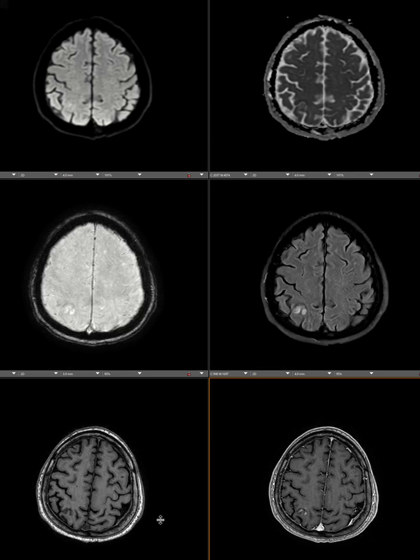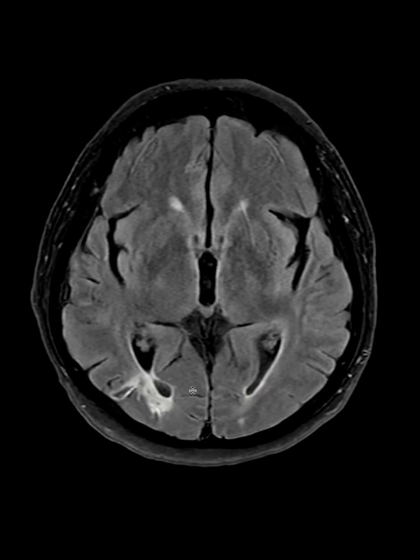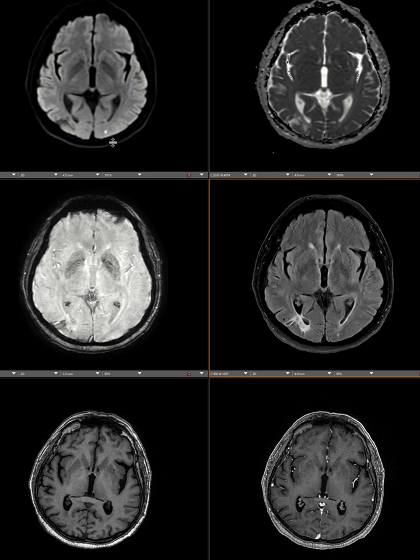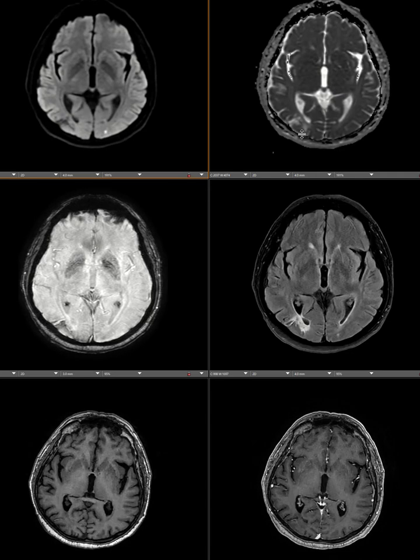And then finally, we're going to look at the chronic infarct. So basically, we have those cells that died already, and that brain parenchyma is lost. And then we have some cavity in those regions. So this is the area that we call cystic encephalomalacia. We see that there is some gliotic reaction in the area of prior infarct, and there is some volume loss. And then, of course, we're not going to see any abnormal signal on the DWI or ADC map.